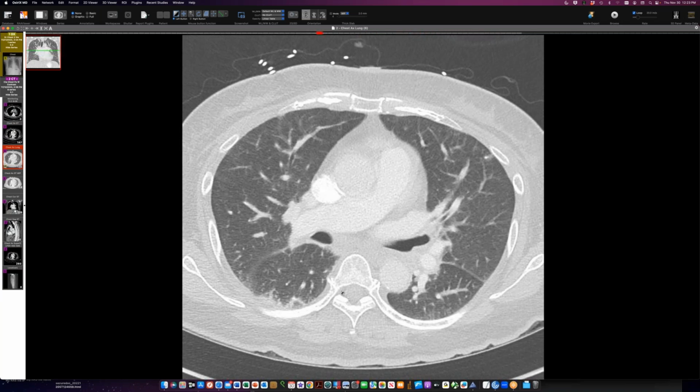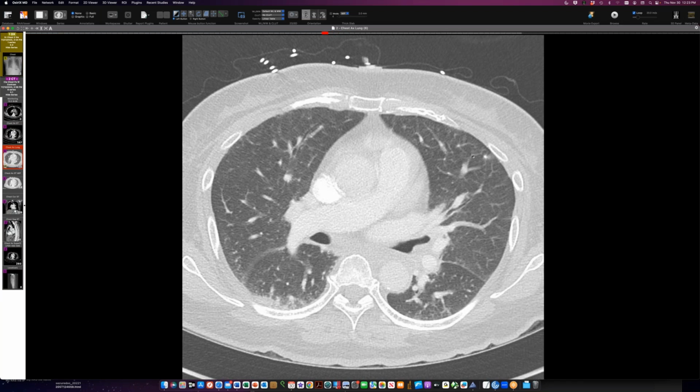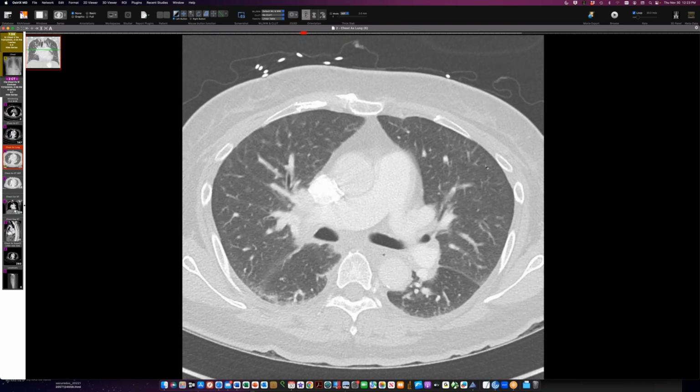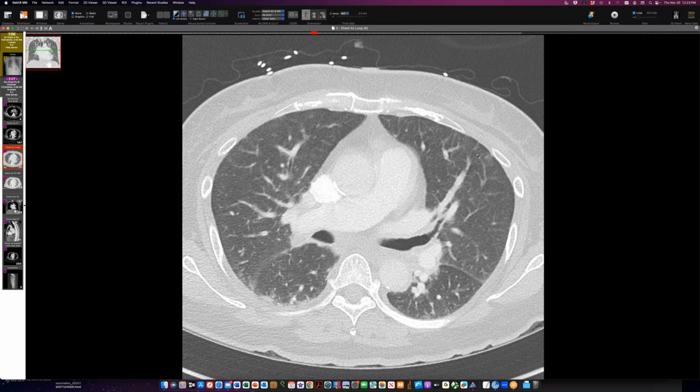So it's really the capillary dilation, and then accompanying that is this macro phenomenon of having the blood vessels that are supplying those capillaries get big too because of the torrent of blood that's shunting through those dilated capillaries. So the vessels feeding them, which is what we're seeing here, are fat. And some of these are veins. These are dilated veins downstream. I think the ones that are in the septa here are veins.